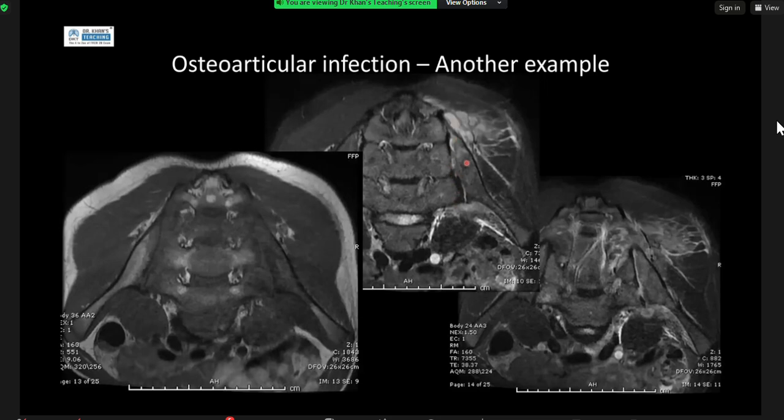And what you have here is just quite a lot of fluid, a high signal within the joint, extends outward into the soft tissues. And then post-contrast, you see these nice little abscesses in the soft tissues, and this is capsular hypertrophy or protrusion, and that's one of the key features to know if there's a SI joint effusion, this capsular bump at the top part of the SI joint. Okay.